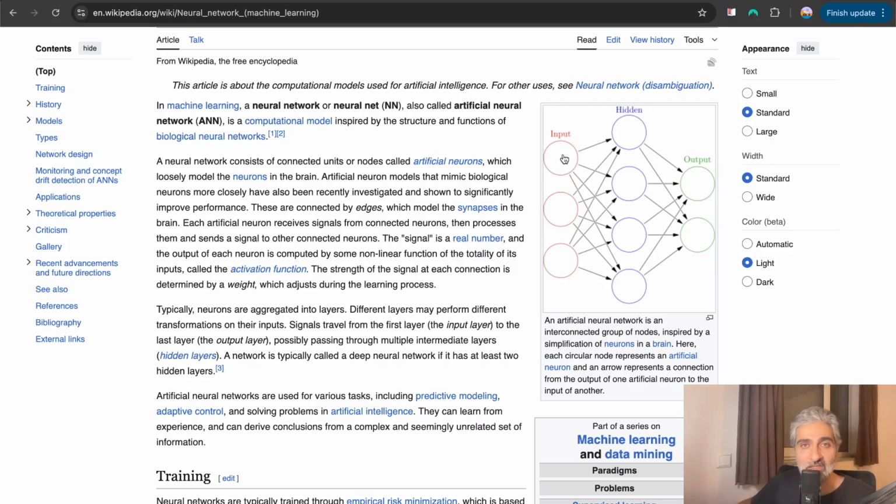Does it have a bleeding or a hemorrhage or not? Then what we're doing is training this convolutional neural network to learn the patterns in the input, to map the statistical patterns to an output, which is hemorrhage or no hemorrhage in this case. So it goes through the first pass, and then we calculate something called the loss. So you're comparing the output to your predictions.